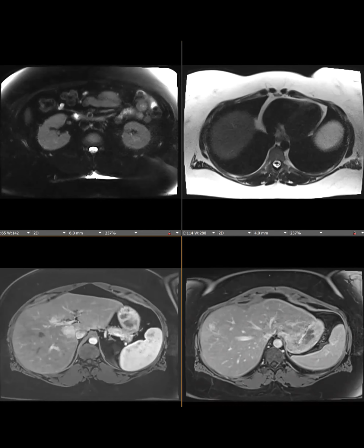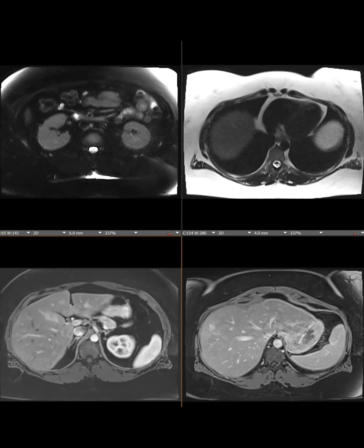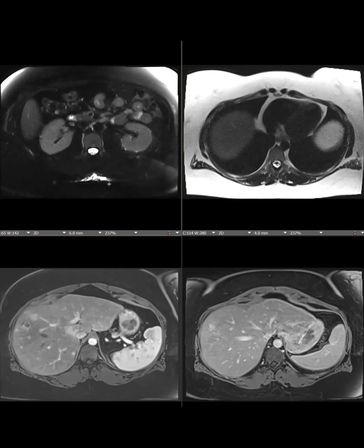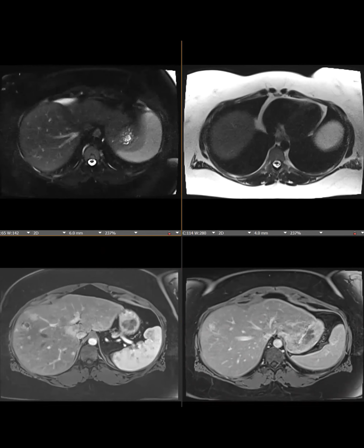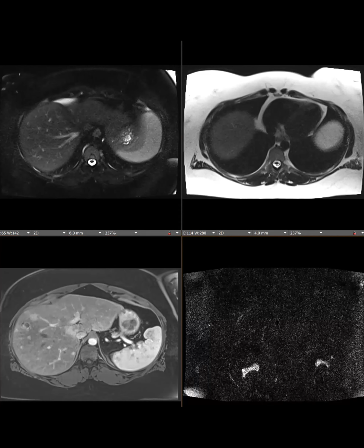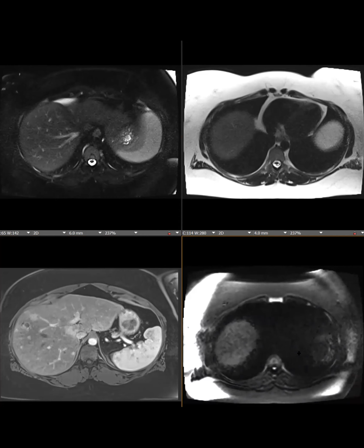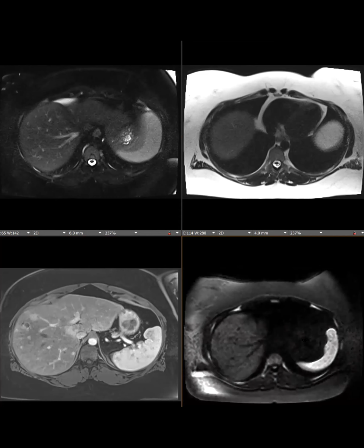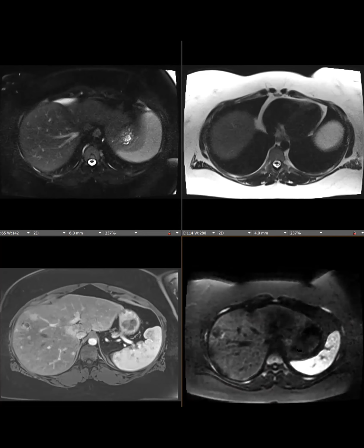Both good thoughts. I guess what struck me is that you just really don't see a lot of other lesions except for just this one really on either of the T2 sequences. So let me just show you the diffusion sequence here. Let me pull one up here. Oh, sorry. I just heard Gitanjali also saying a combination of FNH and hemangioma. And I think she's saying the FNH because we only see these larger lesions on the arterial. And that's a great thought.